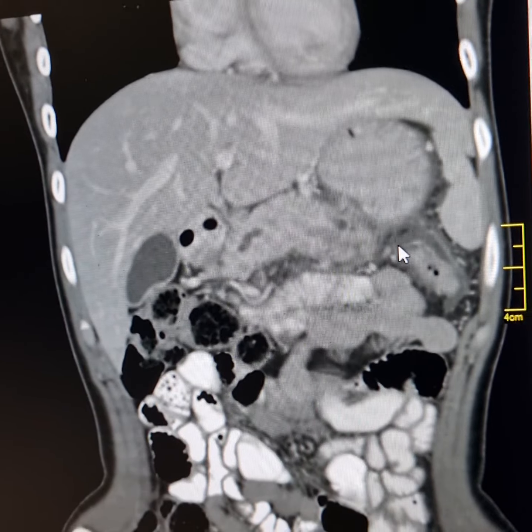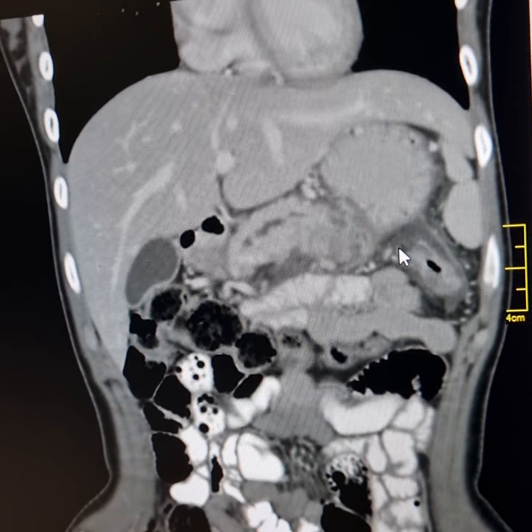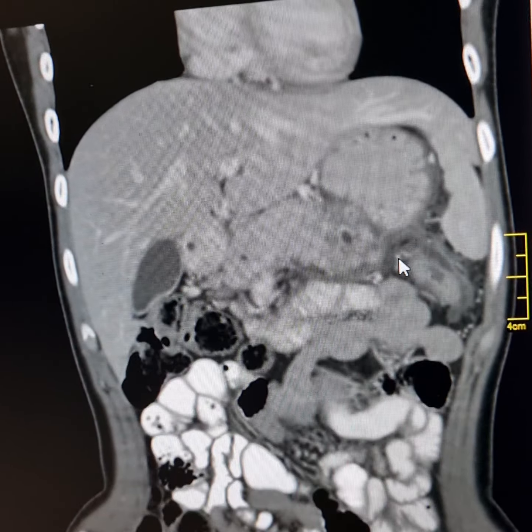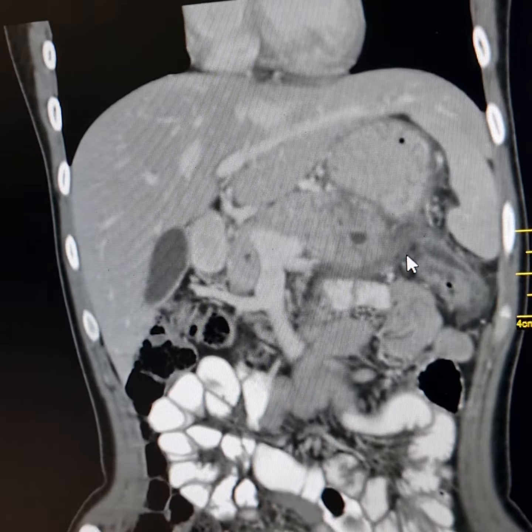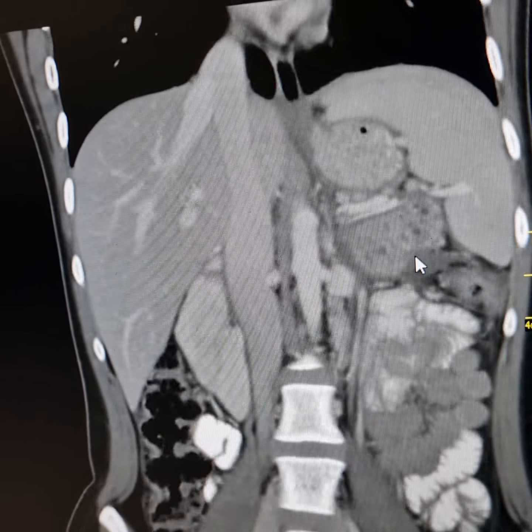ERCP of this patient was also done, which reported a narrowed pancreatic duct in the region of the lateral part of the body of the pancreas. There was no comment upon the dilatation of the pancreatic duct in the region of the tail of the pancreas.